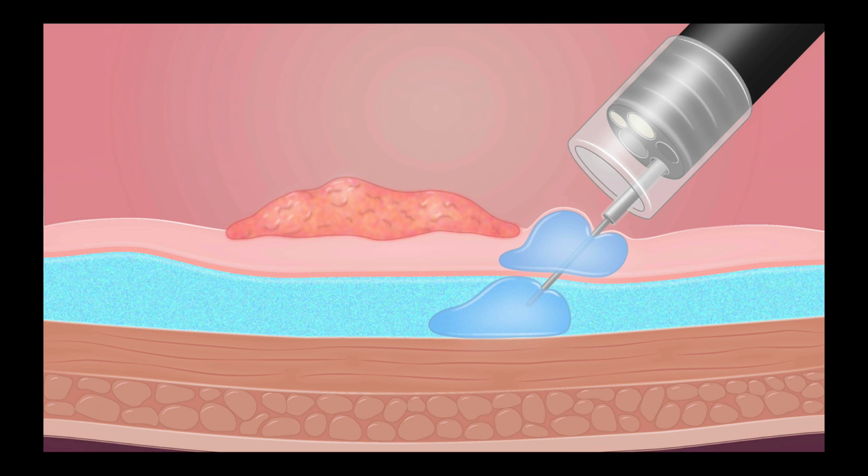If instead of pushing the needle, you pull it out, it becomes very hard to find the submucosal space with lots of holes allowing the fluid to escape out.